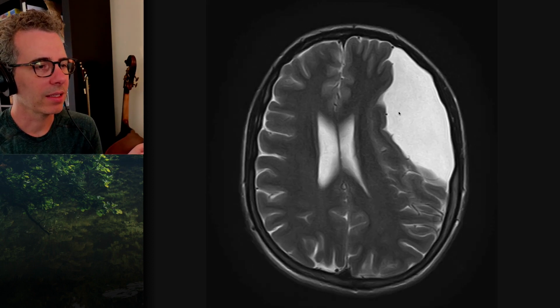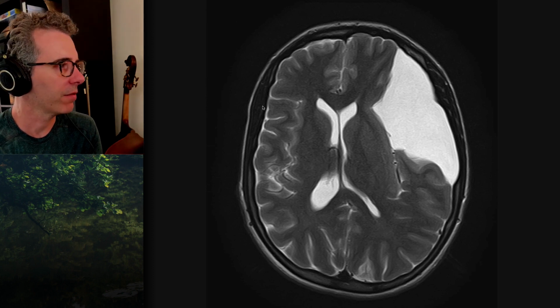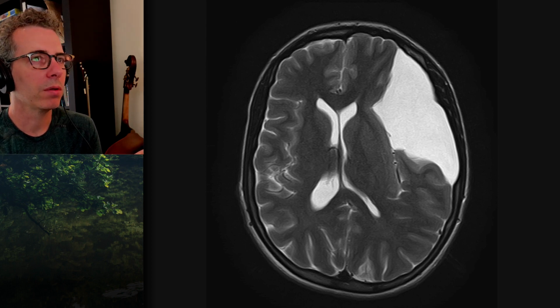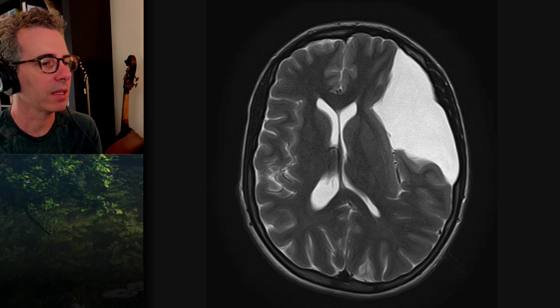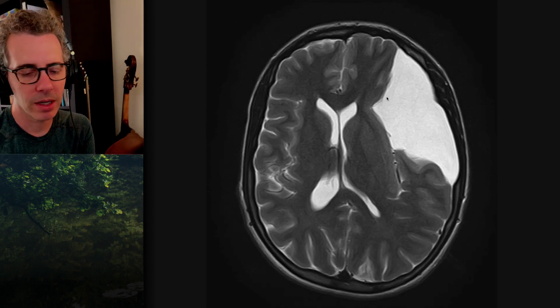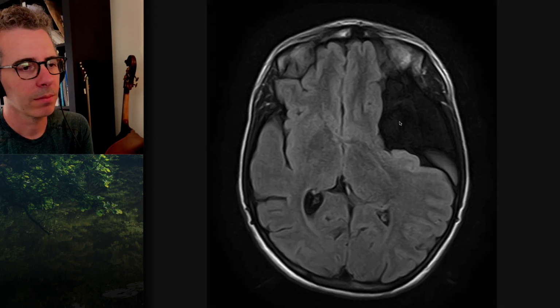Yep. In this case, saying that it's a lesion that has signal intensity similar to CSF on both T1 and T2 is even better, because when you're saying hypo, if someone's not seeing what you're seeing, then hypo just means less than, but it doesn't narrow it down more than saying it's less than this particular value. Whereas saying what it's like, which is the same as CSF, is more precise. So, okay. So on FLAIR, it completely suppresses.